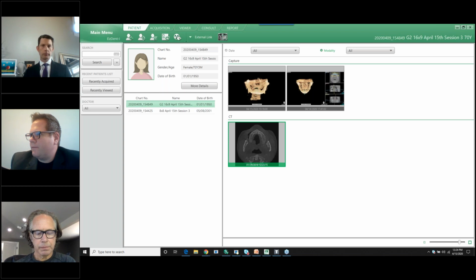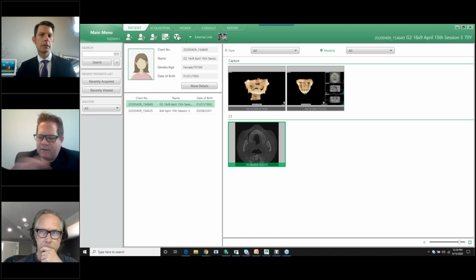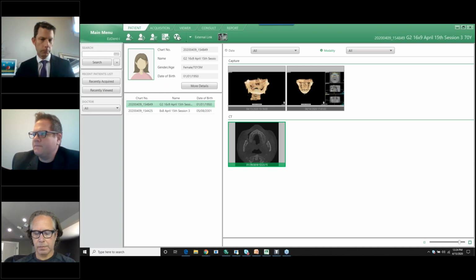Got it. Somebody's asking what determines where, buccolingually, the blue dot in the scout window is. I think he's referring to the 3D pan window and the curve in there. Yes, this blue dot here on the scout is going to partially determine where our target box is.